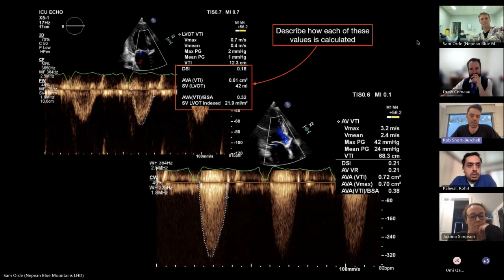So there are many indicators here indicating severe aortic stenosis. So it's the paradoxical low flow, low gradient, severe aortic stenosis in someone. Isn't it just low flow, low gradient? Sorry, low flow, low gradient, severe aortic stenosis in someone with impaired LV systolic function.